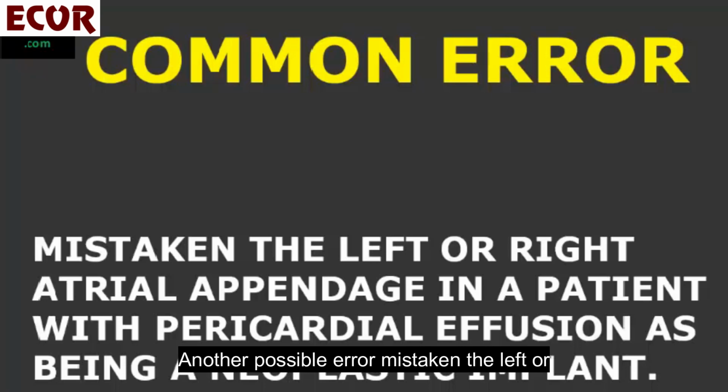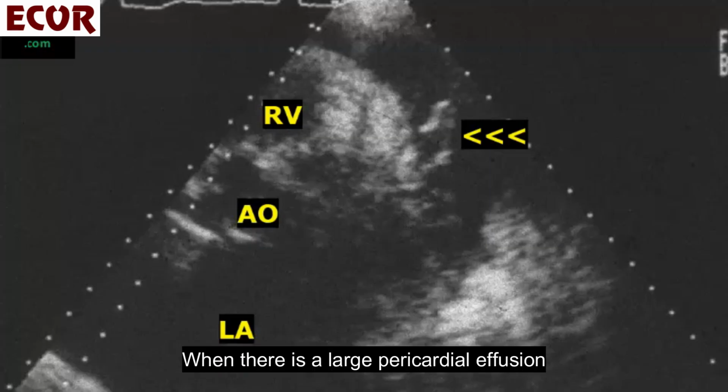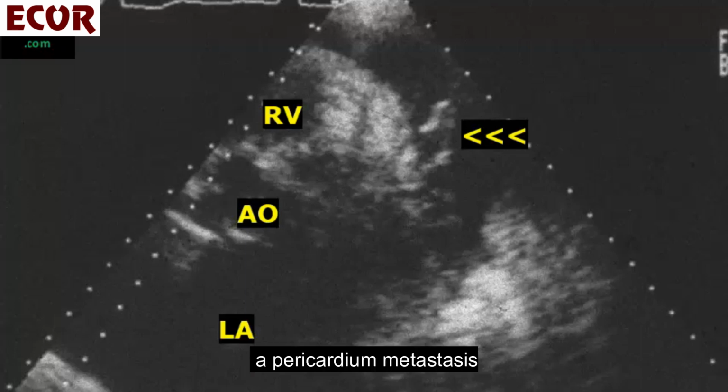Another possible error: mistaking the left or right atrial appendage in a patient with pericardial effusion as being a neoplastic implant. When there is a large pericardial effusion, the atrial appendage may be well seen and may be mistaken as a mass sticking out in the pericardial cavity, like an implant, a pericardial metastasis. Look at this left atrial appendage. It sure may confuse your diagnosis.